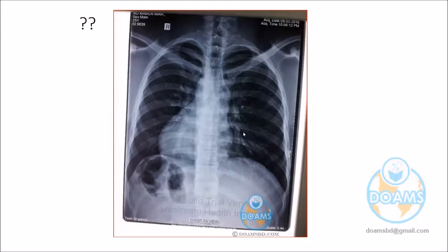But the heart is normal. Too black, too white, too large, or a position problem? What are you identifying? Too black under the diaphragm. But any other thing, a positional issue, Dr. Abdullah? Yes, heart position is abnormal, the heart is going to the right. Is it correct, or are we looking at the X-ray wrongly? This may be dextrocardia.